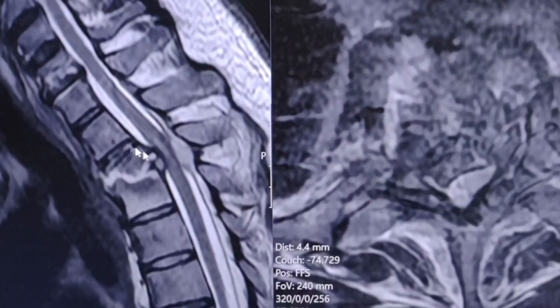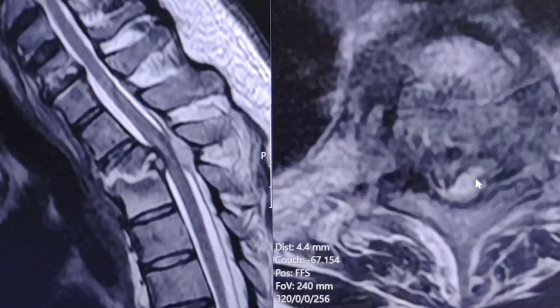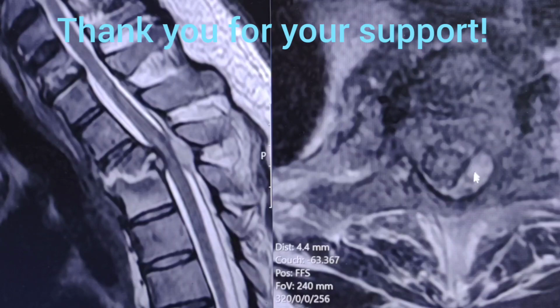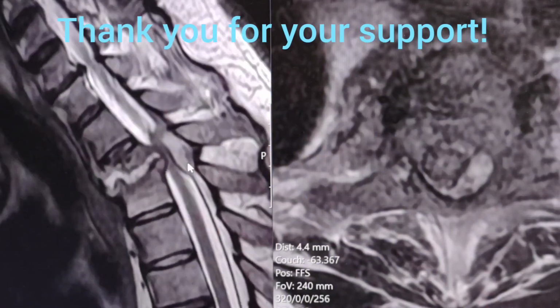Let's go back to the MRI and see the T2 turbo spin echo sequences in sagittal and transverse plane side by side, and let's see the abnormality here, the collection, the abscess, the spinal epidural abscess.